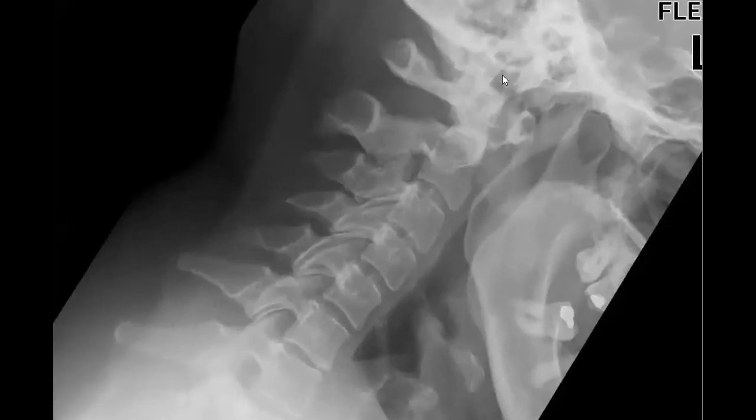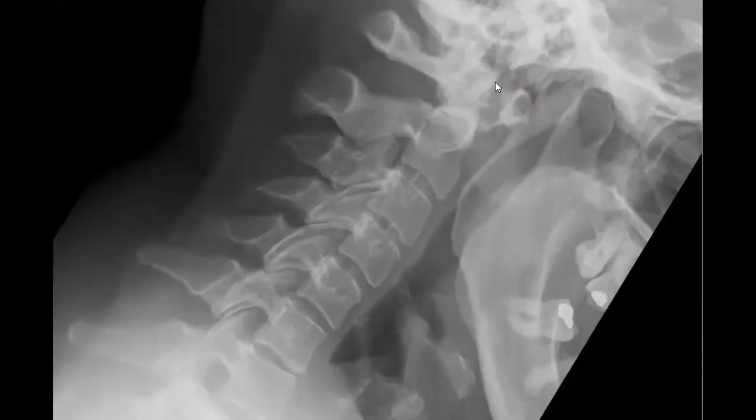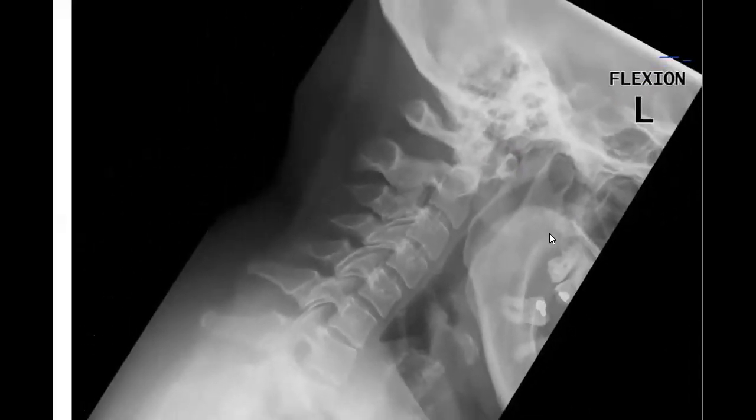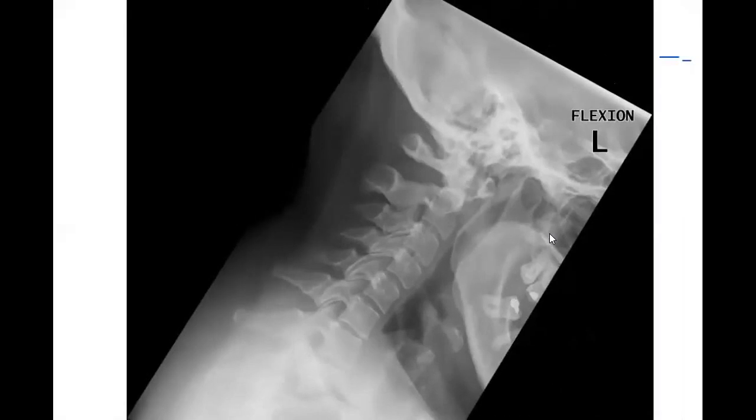You remember the atlanto-axial subluxation, very critical in the exam. You will measure the pre-dental distance, and you know that this distance is critical if it is widened as here. So this means that there is abnormal atlanto-axial subluxation.